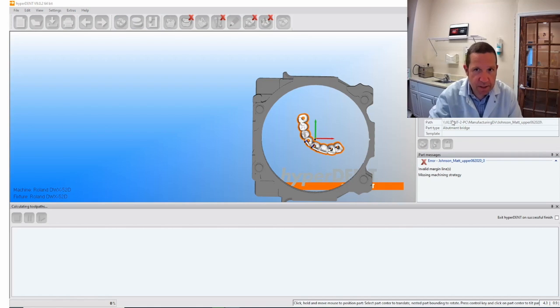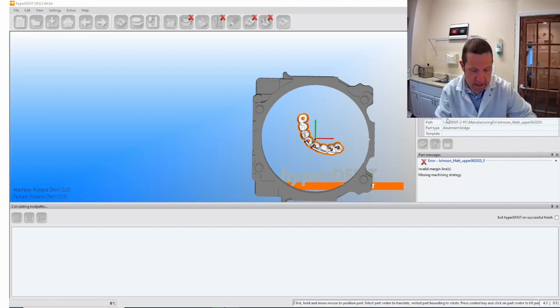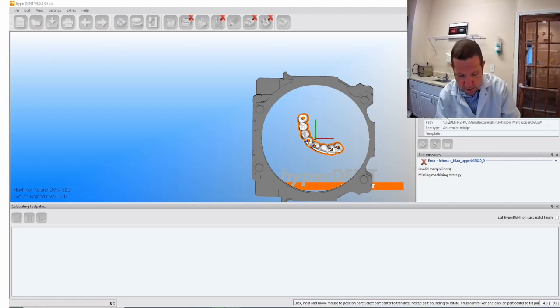It's already telling me that the height is 13 millimeters, the maximum height of the job. So if I use zirconia, which gives me like 20% or 25% shrinkage, probably I'm gonna have to use at least a 16 or 18 millimeters disc. So I'm gonna use an 18 in order to be safe. So I have Argem zirconia.